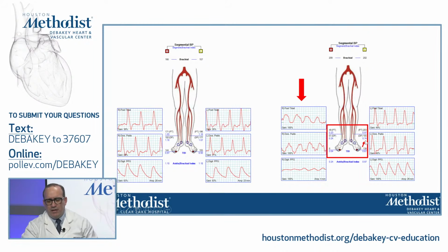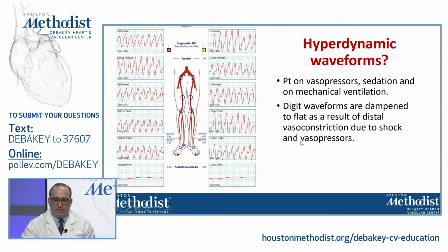So the question is, is that a correct brachial index for the anterior tibial, or are we suspecting, with almost normal tibial waveforms, that there's some more proximal disease above the tibial segment? But certainly you can see the difference between almost normal to normal and significant disease on that same patient.